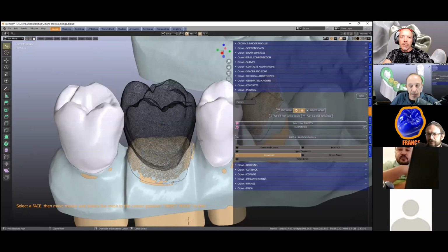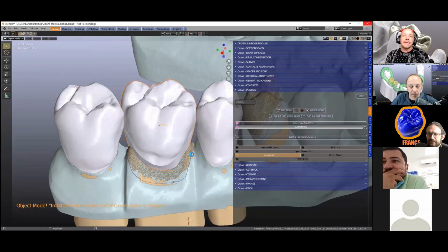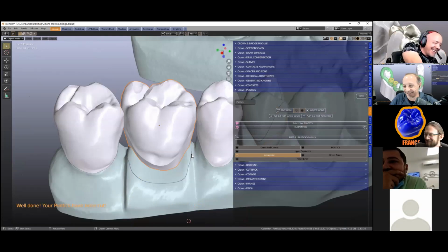I've been working on this today. Let's just have another look at this. Cut Pontic. Okay, I think it was because it was in edit mode. Okay, so that's fine. So let me just write this. Okay, no, just kidding. I know what to do.